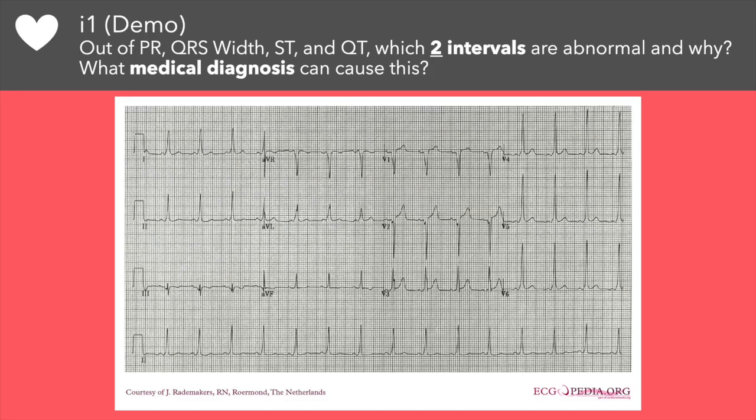So yes, looking at the lateral leads, there might be evidence of LVH. However, Wolff-Parkinson-White may mimic LVH, since a right-sided accessory pathway may direct depolarization towards the left side, amplifying the R-wave amplitude in V5 and V6, and also the lateral limb leads 1 and AVL.